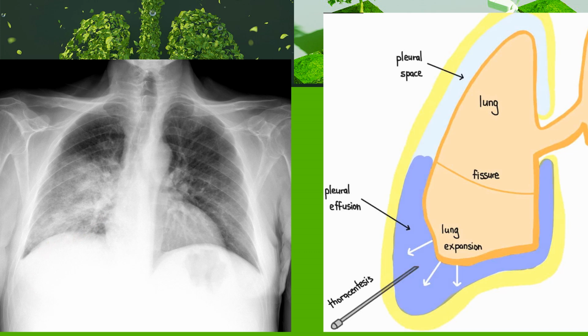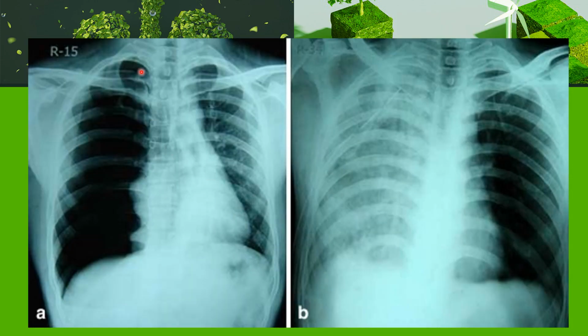We will see another chest X-ray. This is the pneumothorax. You can see here this jet black, no vessel markings. Here you can see vessel markings, and here no vessel markings, with the border of the lung and pleura, and collapsed lung here. So this is a huge, large pneumothorax causing tension pneumothorax as well.